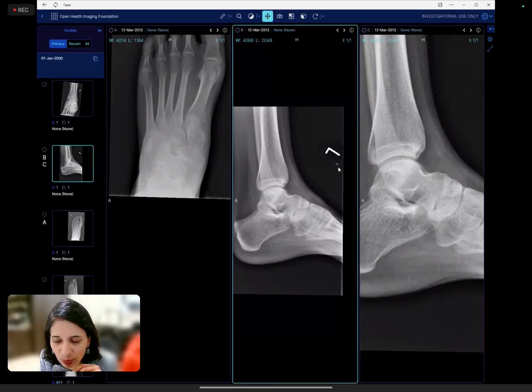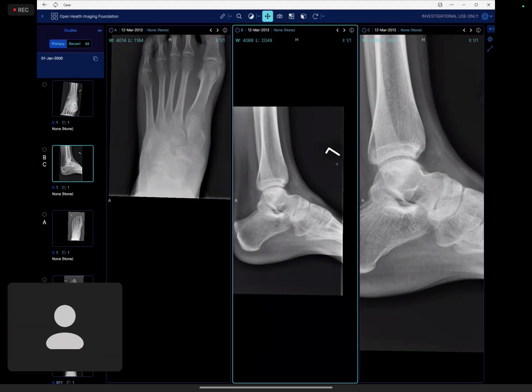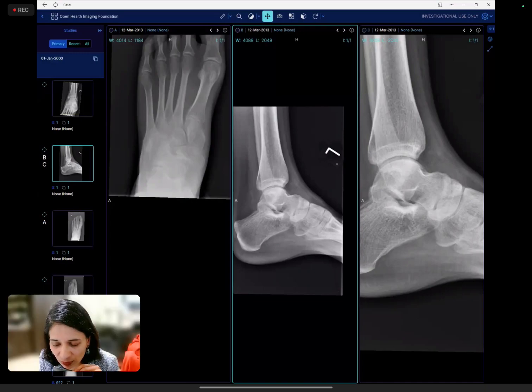And the carpometacarpal dislocations, where the fourth and fifth CMC joint. Yes, that is the other one. Very easily it can be missed, because patients will come with a swollen hand, and ED will just say query injury. If you don't pick it up, they will not pick it up as well.